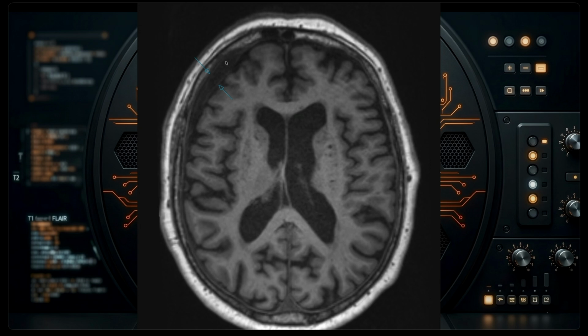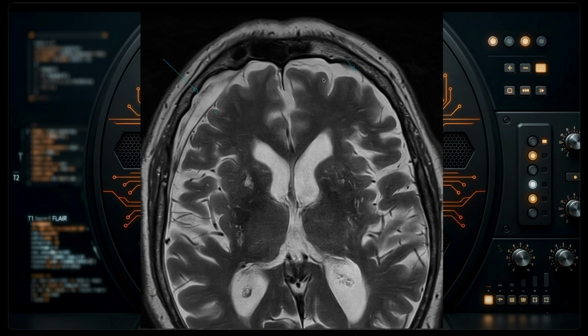Notice also that the signal density of the fluid inside the chronic subdural hematoma is higher than a normal CSF in the subarachnoidal space. On this axial T2 weighted image, we can see in very close detail what really happens in the subdural hematoma, expanding the subdural space.